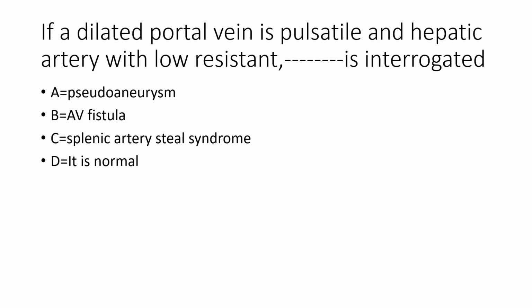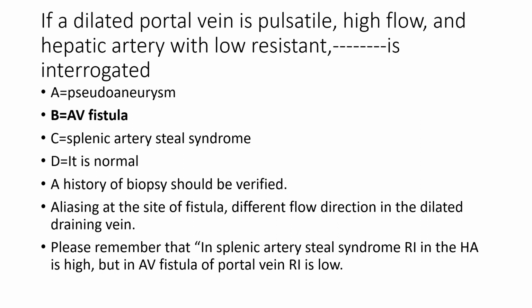We see a dilated portal vein that is pulsatile on spectral. It is pulsatile like the hepatic vein, but we know that the hepatic vein is here. Okay, pulsatile and dilated, we should think about an AV fistula.